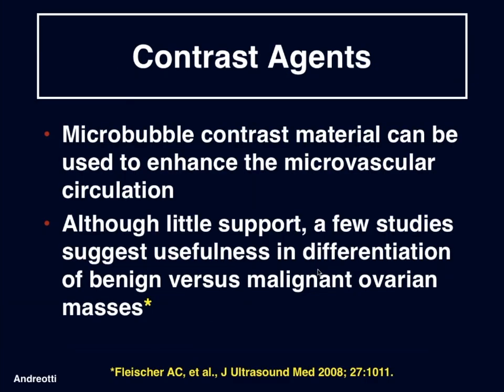So one more technique I'd like to mention is contrast agents. This is microbubble contrast material that can be used to enhance the microvascular circulation. And although there's little support for using it for the indication of evaluation of the pelvis, a few studies suggest usefulness in differentiation of benign versus malignant ovarian masses.